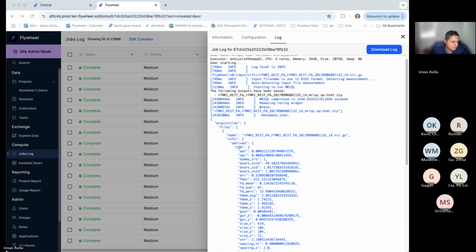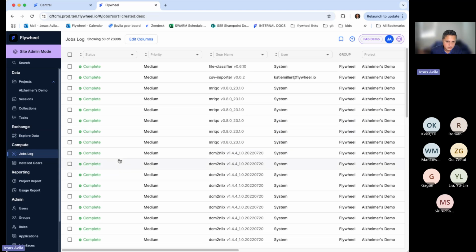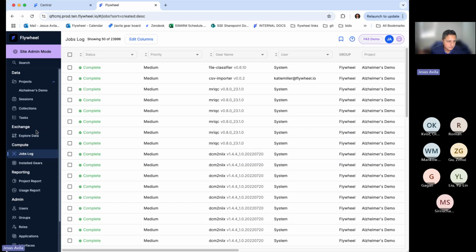Okay. All right. Custom classification. I think most people here are familiar with what classifying means. So if you have a person who has blue eyes or brown eyes, that kind of thing. But that's a general example, so let's look at a more medical imaging example.